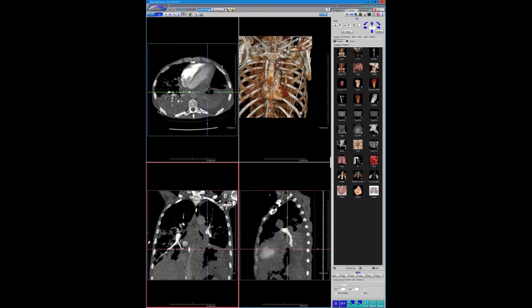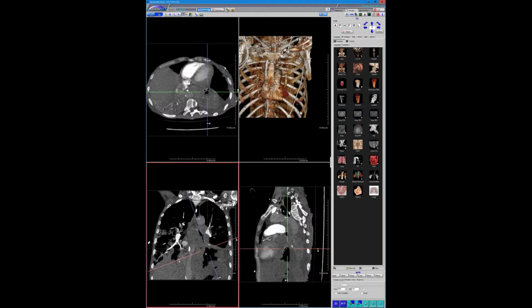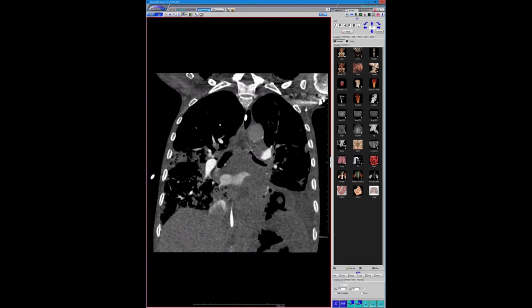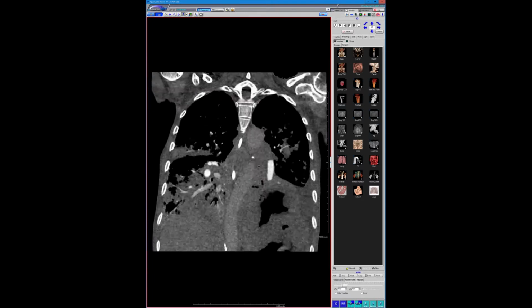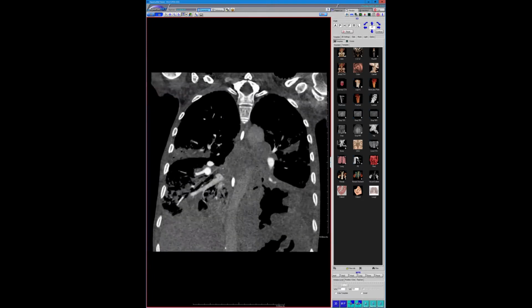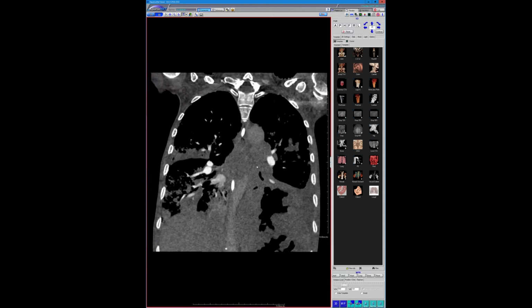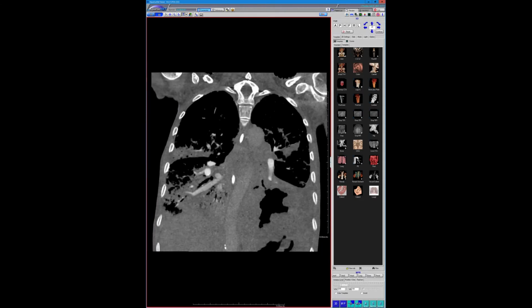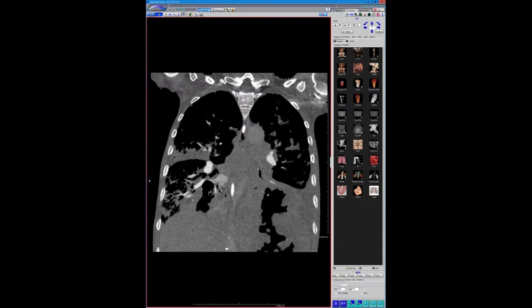But she had an outside CT, so I called the ER because of course this is a PE study and the only history I literally get is just shortness of breath, like I think we all get. And I say, there's this big fistulous thing between her necrotic lung cancer that is eating through her diaphragm and into her stomach. And they're like, no, it's the spleen. She has an outside CT and we know that she has a lung cancer that is eating into her spleen. So this is a bronchosplenic fistula, basically.